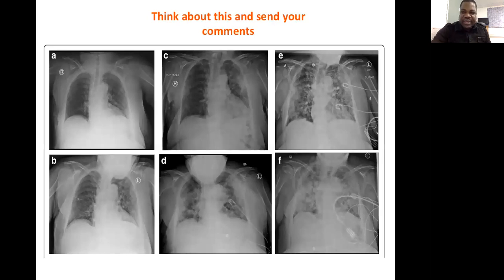Now, I will leave these images for you. Pause your video for a few seconds, think about this and write your comments, your interpretation about those 6 images that I will leave with you. So, what am I saying?